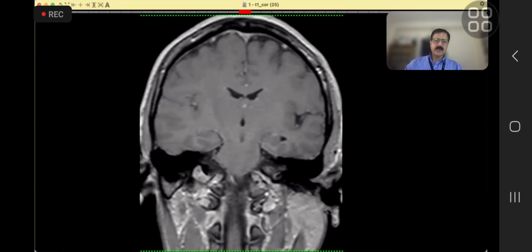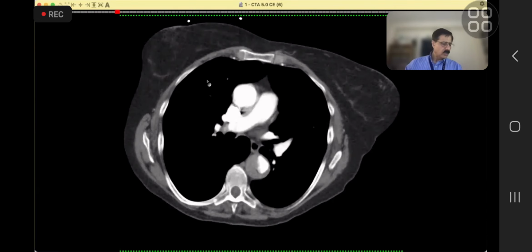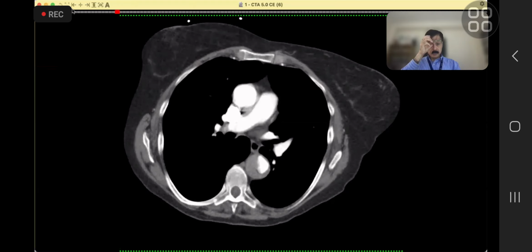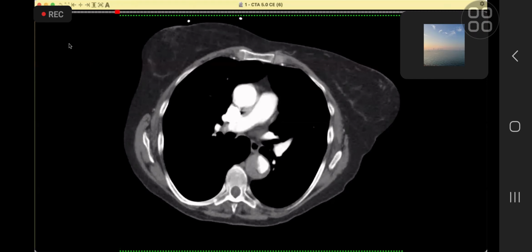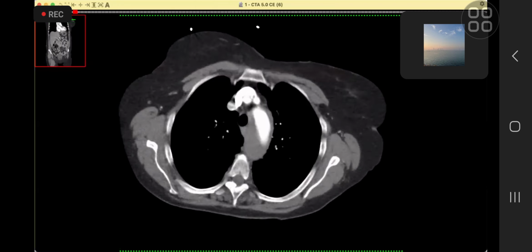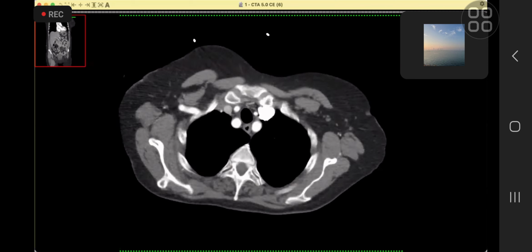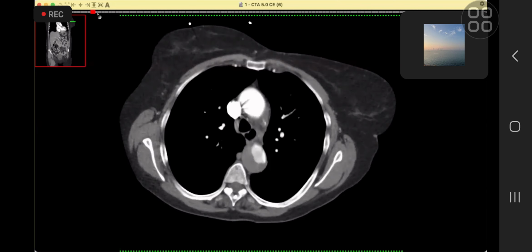Okay, now next. Candidate 2. This is a 67-year-old with acute chest pain and acute upper back pain, in A&E. Over to you. Okay, doctor, I'm requesting a remote control. This is what appears to me to be a CT angiogram. I'll start scrolling, then I'll comment on the images.